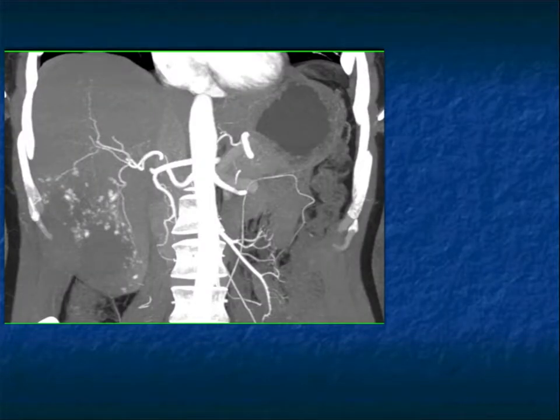And you can see as you carry on into the study, the peripheral puddling increases. When you go over further time, the lesion will become isodense in most cases, though you may see a central scar. In the old days, it was felt that to call something a hemangioma, you had to have full enhancement. The lesion had to become isodense, but we no longer find that to be the case. Often you would wait 30 minutes for it to fill in, which we don't do for anything. The point is the early study, that peripheral enhancement, really makes it easiest for me.